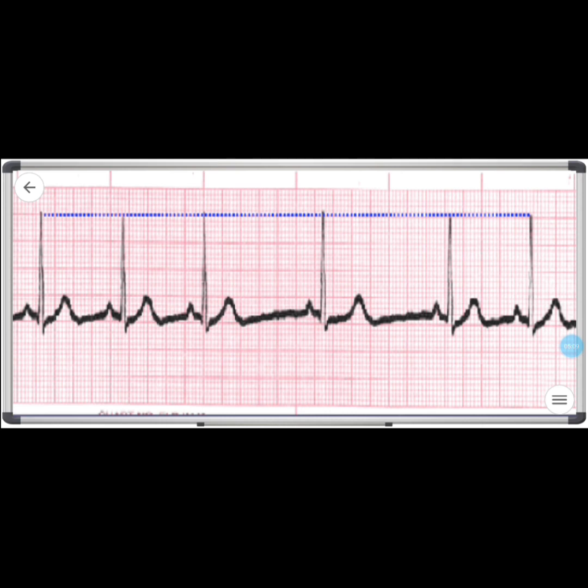Now, if we look at this ECG, let's analyze it. Every P is followed by a QRS. P is followed by the QRS, P followed by the QRS. It's there. The second thing is the PR interval. The PR interval seems constant everywhere, and the P wave morphology is the same everywhere. So it's a sinus.